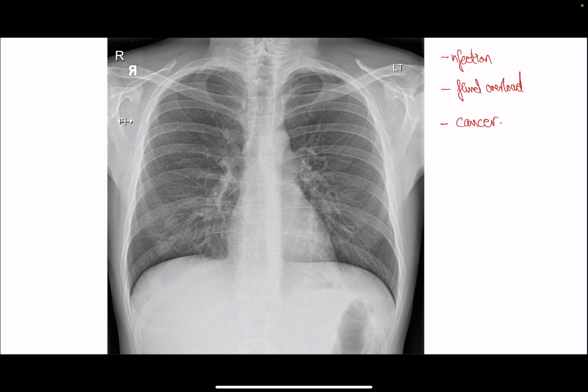So first of all, looking at a chest x-ray, we can see these are lungs, and we have two lungs as you know. And the benefit of having two lungs, especially from a chest x-ray perspective, is that we can compare one side to another and see if there's abnormality, and that helps us figure out if that requires further investigation. So the normal lung looks gray. As you can see, this is air, looks gray on a chest x-ray.